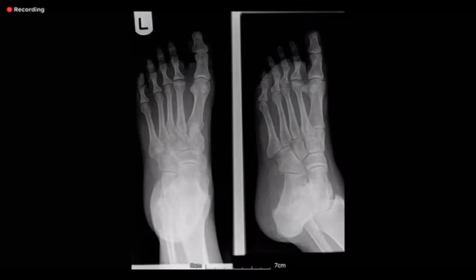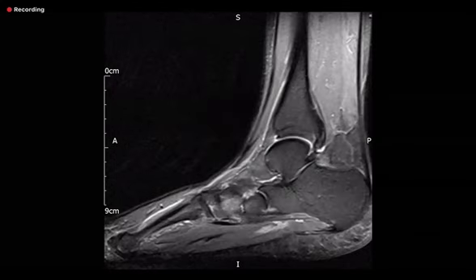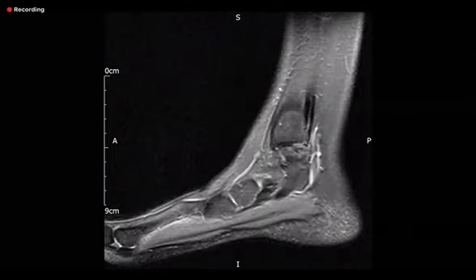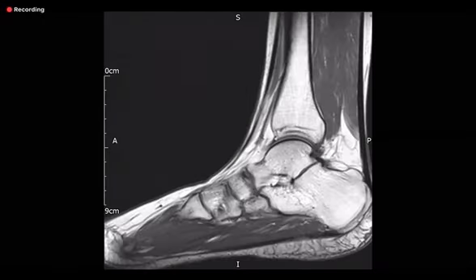So doing an MRI would be helpful to look at the underlying. So you keep looking at this MR, and I am scrolling it for you. Okay, there's signal abnormality. Excuse me, keep looking, because of time factor. I'm going to go through it and keep looking, and then you will tell us your findings.